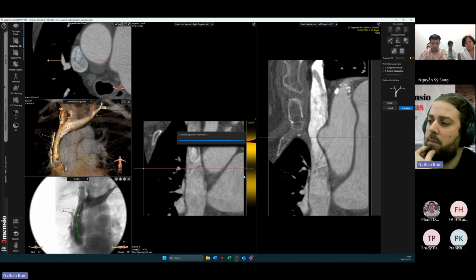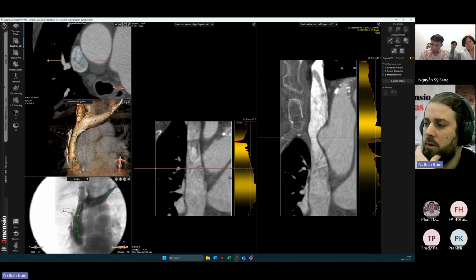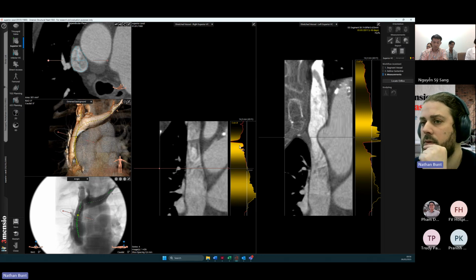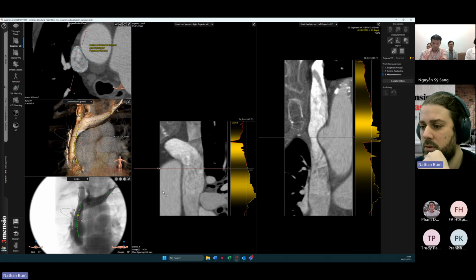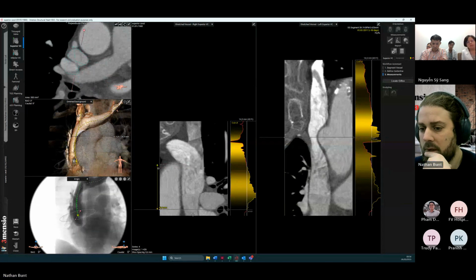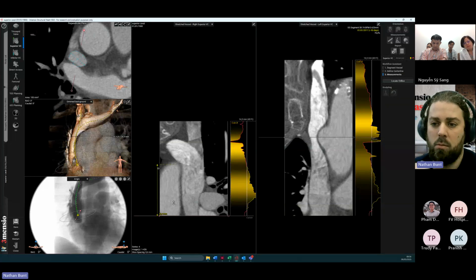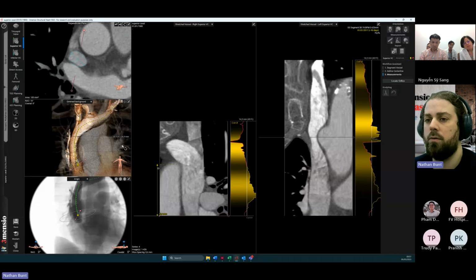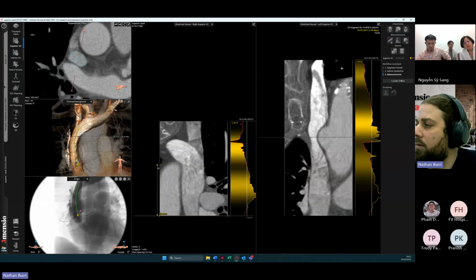In the measurement step, you'll see that we get our measurement panel again. So this really just looks like the femoral step, where we get a rough impression of all the diameters. We can lock in automatic polygon measurements. We can do diameter measurements to, for example, measure the length to the first bifurcation, so that we know how much room we have to land our valve if we want to go for a valve in the superior vena cava as well.